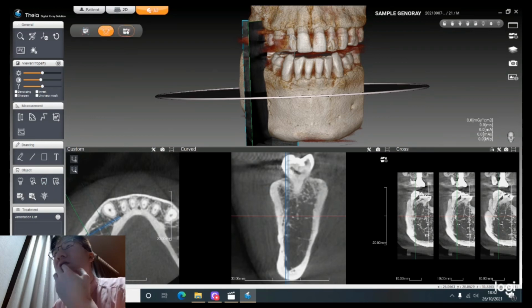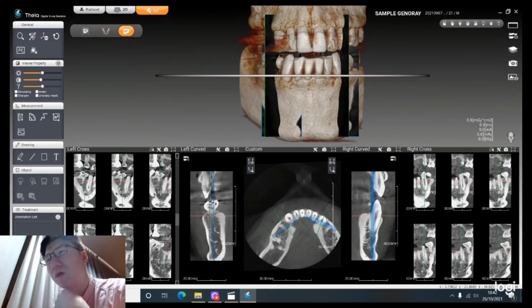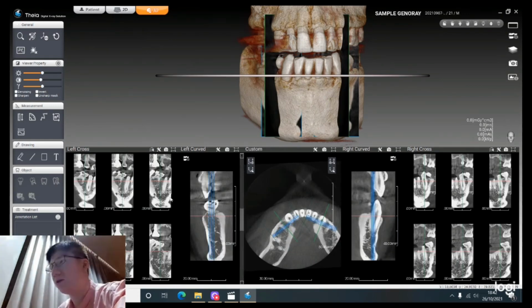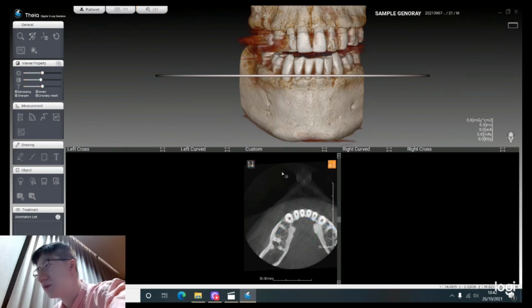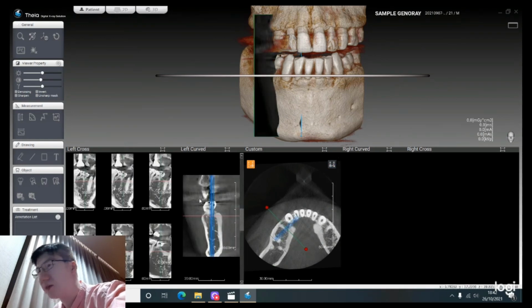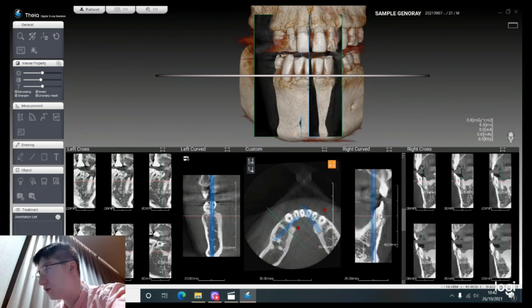Okay, and you have this TMJ view, which just shows more slices of the pictures individually, right and left, like that. Let's say I want to choose the left part, and then you need to cut two lines there. That's the way you do it. Now you have the view there, and you have this view too if you want it.